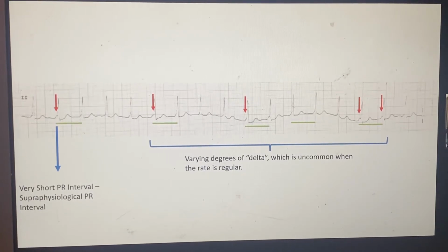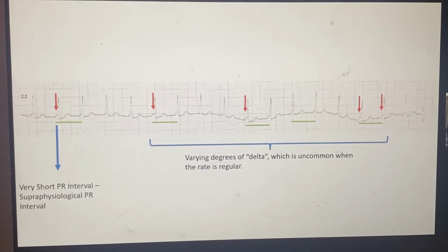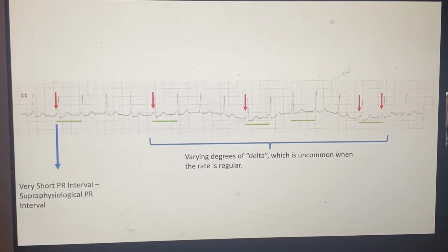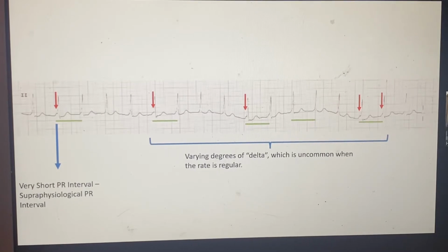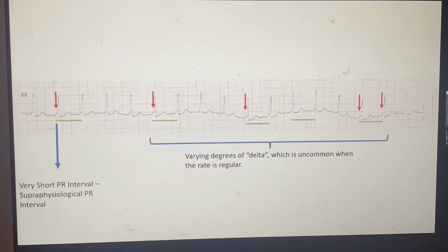Yeah, very ambiguous. I agree with Dr. Ridwan. It's a very good differential diagnosis. When we find isorhythmic dissociation, you cannot just leave it there and feel proud, like, oh, that's a very good diagnosis that I came up with. You have to either increase the rate or reduce the rate and unmask what is underlying the isorhythmic dissociation. Yeah, very good explanation, because it's very hard to pinpoint.